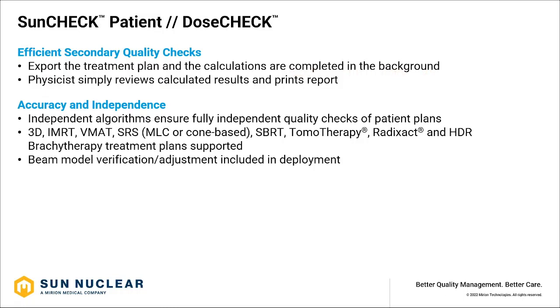All major TPS systems are supported as long as they can do a DICOM export of the patient plan. The physicist can then simply review the calculated results, and we do give you the option to print a PDF report of the results themselves.